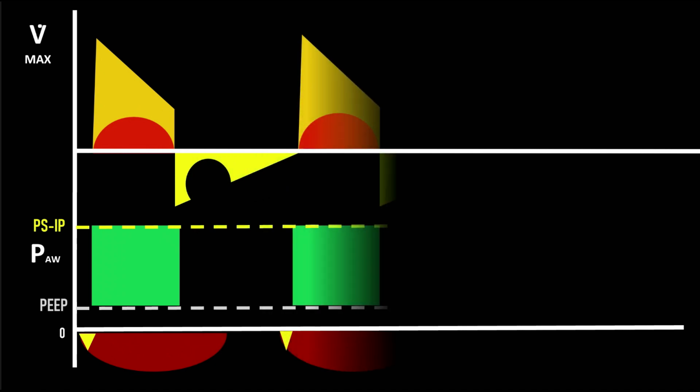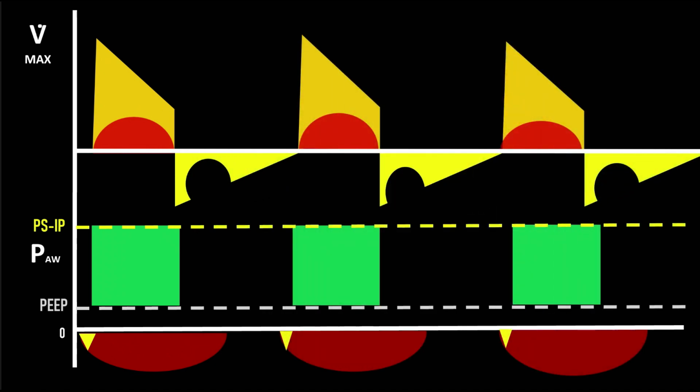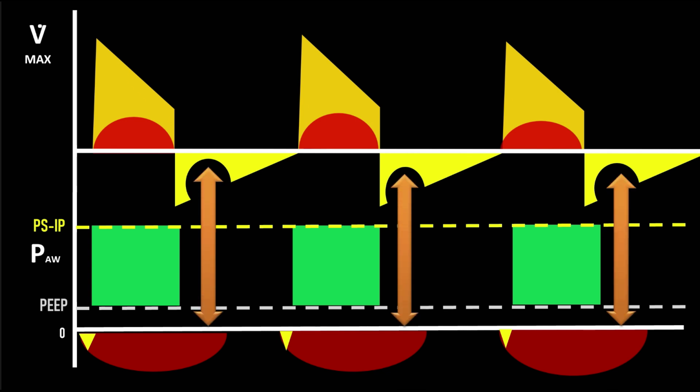This is likely what is happening in the current scenario. The key item to follow is the red negative pressure waveform below each breath. The negative airway pressure that the patient is generating extends outwards beyond the pressure waveform. While this may not have an apparent effect on the pressure wave because flow has stopped due to the short expiratory sensitivity, the patient is now able to generate positive flow in the system after the inspiratory valve is closed. Hence, the expiratory waveform is indented.